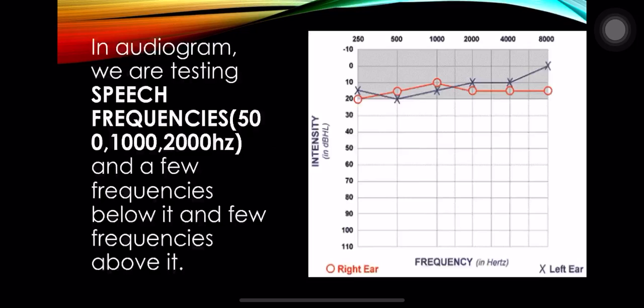Now, in an audiogram, we are testing speech frequencies like 500, 1000 and 2000 Hz and a few frequencies below it and a few frequencies above it.